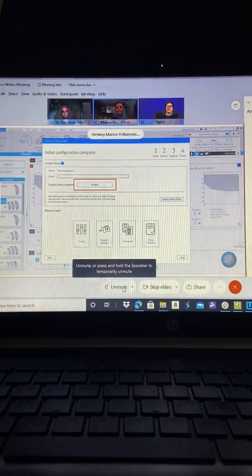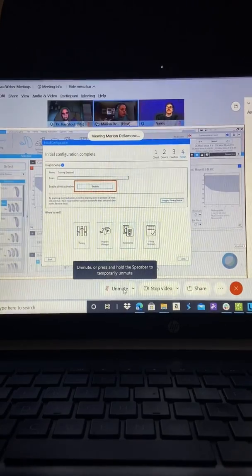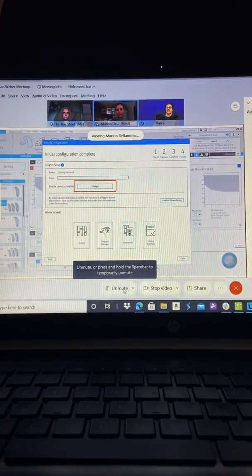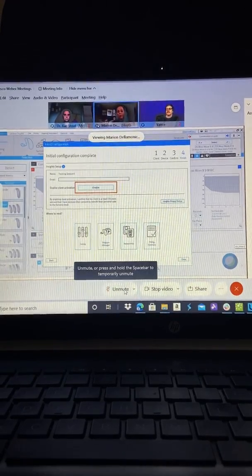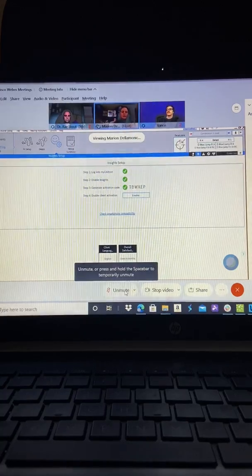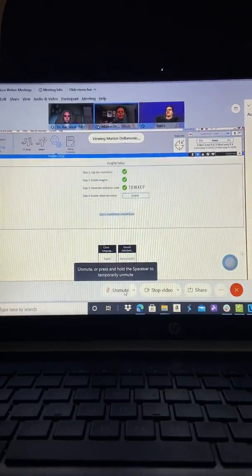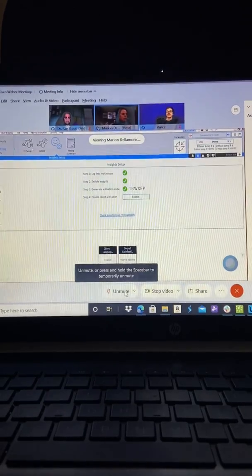Now, you'll only see these screens in the first fit. So what if you want to go to tuning and then you go, oh, I forgot to click enable there? Or you want to enable Insights at a follow-up or subsequent appointment. You can still always access this in our end fitting insight setup screen. Okay. So right in here, we still have the same thing.